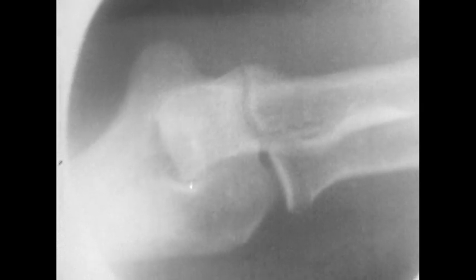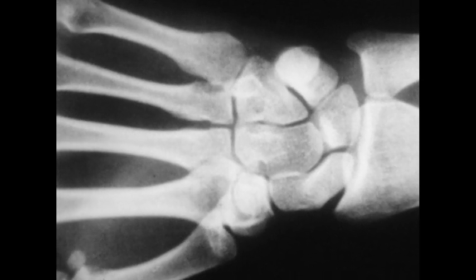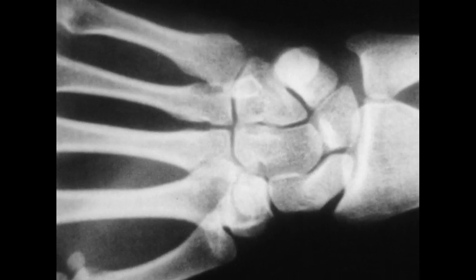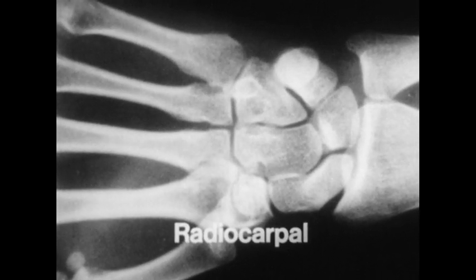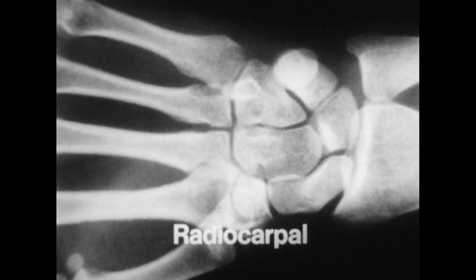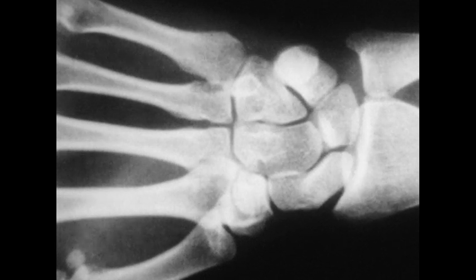At the elbow is also the proximal radial-ulnar joint. Here the head of the radius fits into the radial notch of the ulna to form a pivot joint. The articulations of the forearm and hand are divided into two groups, a proximal or radiocarpal joint and the intercarpal articulations. The radiocarpal or wrist joint is ellipsoidal with mixed rolling and gliding movements.